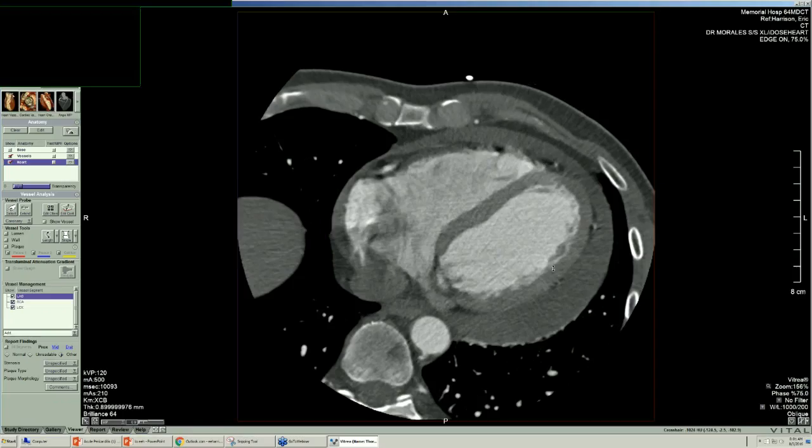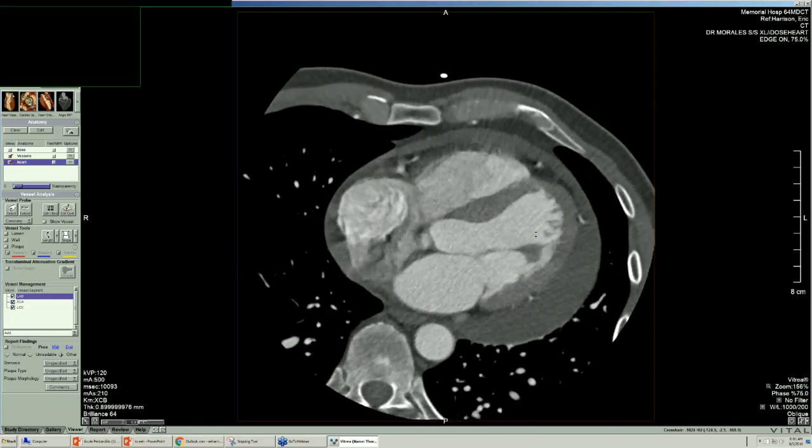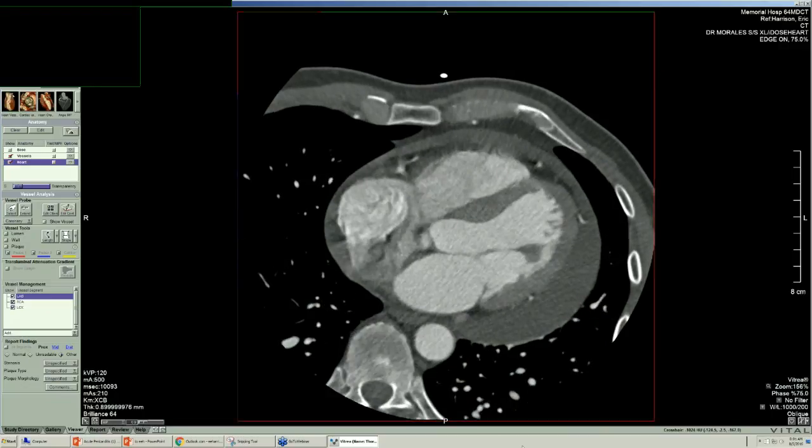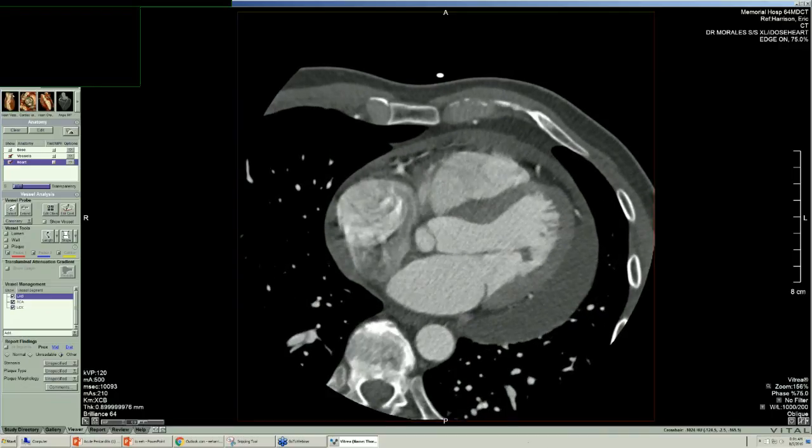And so you can see how different this image, which is a CT image, is. You can tell it's a CT because of the density of bone. Bone is very white on a CT, but not on an MRI. And then instead of seeing the black space, now you see a fluid-filled space that looks different, and we can give you Hounsfield units for density, and we can measure that. So this is the density of water, fluid: -17, -6, 9, 0. So it's all revolving around 0.